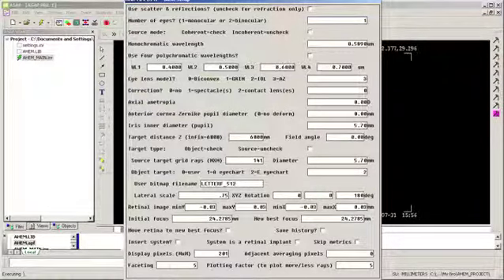I can also insert a system that's totally independent of the eye, and it can be anything, some instrument or whatever I have that I want to integrate into the model. If the system that I'm inserting is a retinal implant, I select that because that puts it inside the eye. I can opt whether or not to skip the default metrics that are generated with the eye, which are various measurements of quality.